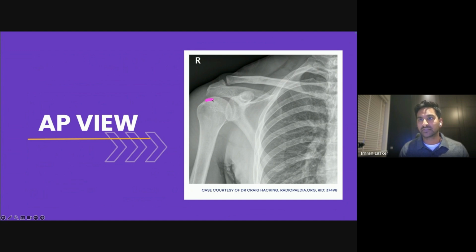So this is the humeral head, right? And then you've got something called the greater tuberosity and your lesser tuberosity. But mainly you want to be concentrating on the humeral head. You've got the neck of the humerus, and then you've got the shaft of the humerus. It goes all the way down like so, right? And one of the main things to do at the very, very basic level is just to draw along the line and make sure that everything aligns really, really nicely all along like so.